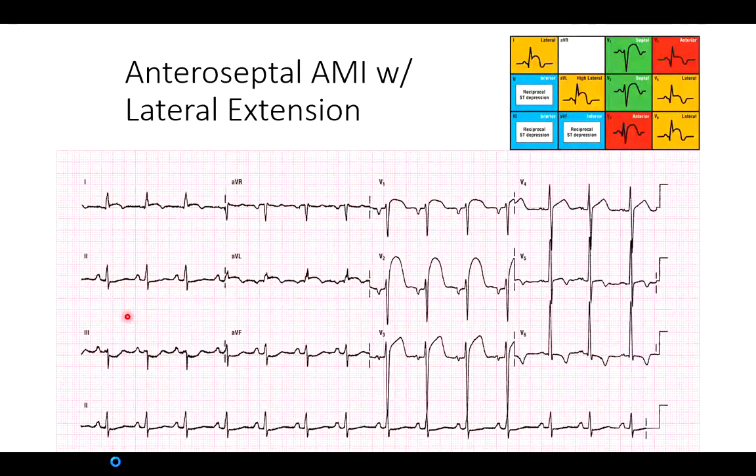So lateral, we might also see these depressive segments in the ST segment. So a lot of different things that can occur. Just as an example there with identifying acute myocardial infarction, but when you see tombstones, not good. And so identifying location might give the cardiologist an idea of what area of the heart is impacted.